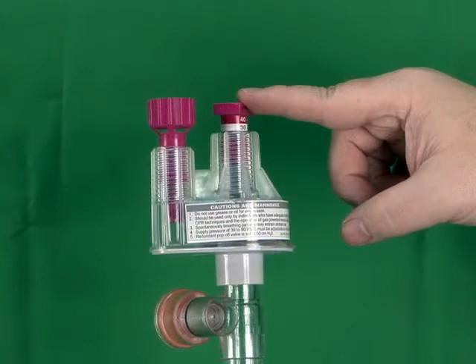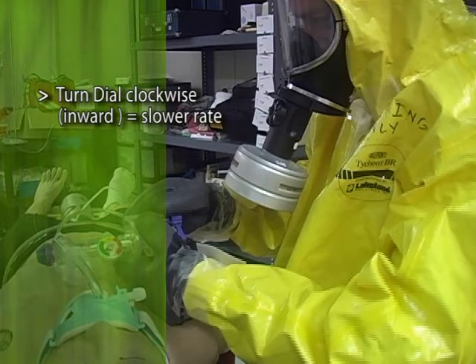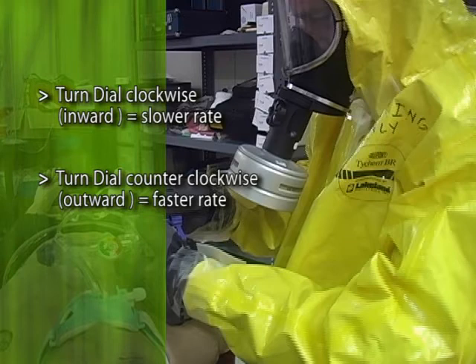This may only be accomplished after the patient is connected to the automatic resuscitator. To slow down the patient's breathing rate, turn the rate dial clockwise. For a faster rate, turn the rate dial counterclockwise. For a non-breathing patient, set the automatic resuscitator in the pressure control mode, which provides automatic cycling. Adjust the rate dial to the desired rate and count off the breathing rate manually. If the resuscitator does not cycle, back out the rate dial until the device starts cycling again.